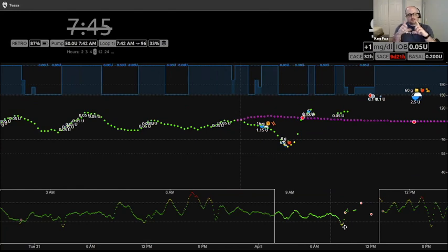On your phone, it's kind of hard. It's small, so it's hard to be precise, but you can do that. And scroll backwards and take a look. So if you guys have a Nightscout site, I'd encourage you to have it open and flip back and forth with me as I do this, but you can scroll back quite a ways.